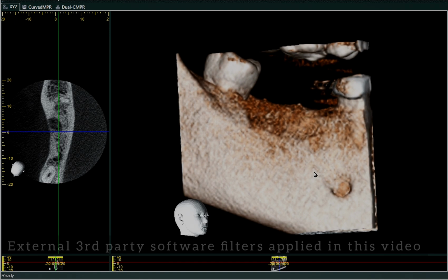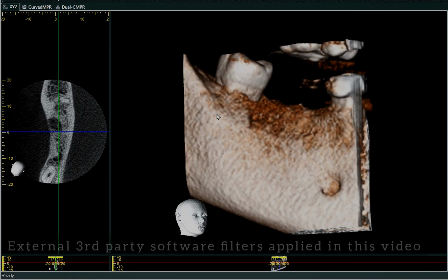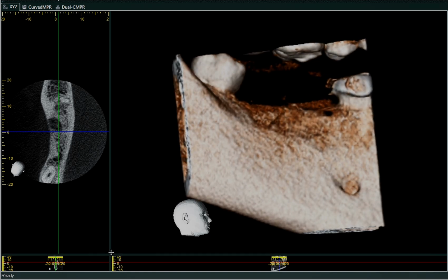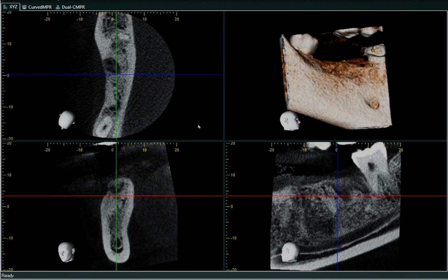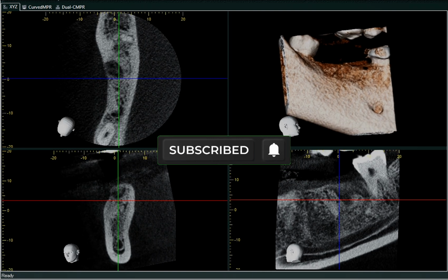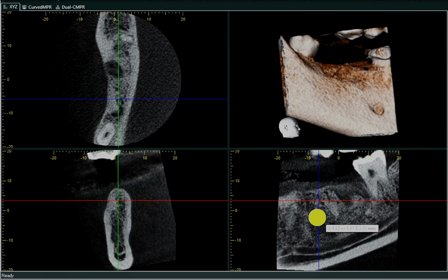Basically, the patient came to the dentist with a chief complaint of missing teeth in the lower right side region, and she was referred for a CBCT scan for the same. So a CBCT scan was taken of the lower right quadrant, including the 4-5 region. 4-6 and 4-7 were missing. One was recently extracted, about 5 months back, and you can see the healing socket or the healing radiolucency in the sagittal cross section. Another one was extracted a long time back.